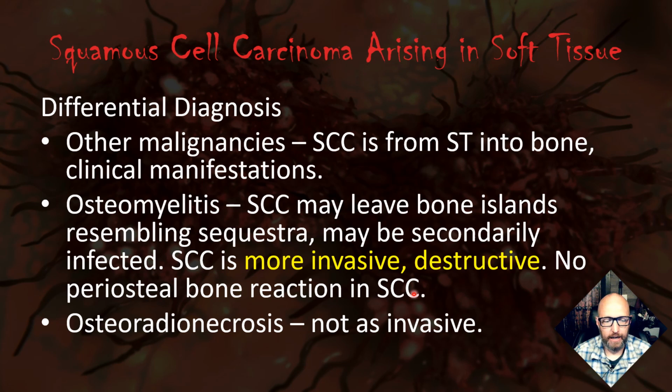And then this is a key here. No periosteal bone reaction in squamous cell carcinoma. So your typical carcinoma or your typical malignancy of the mouth is not going to cause that periosteal bone reaction.